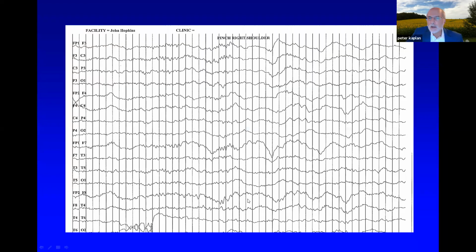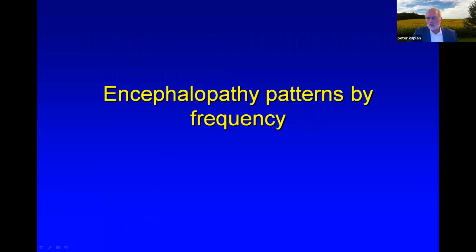Now here, I wanted to show you what one of the spindle comas looks like. And here you can see the spindle itself, and it's riding on top of slow delta activity, which resembles, in fact, a vertex sharp wave. And this resembles a K complex. So it looks like sleep, but from which the patient is unarousable. You can pinch the patient and nothing improves in the EEG.